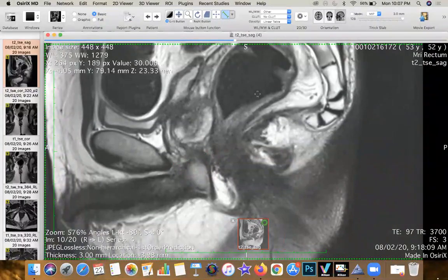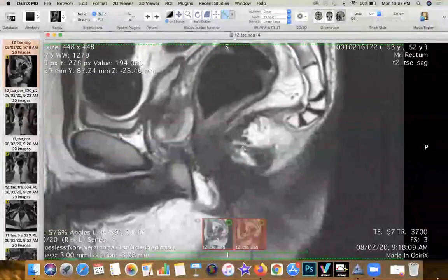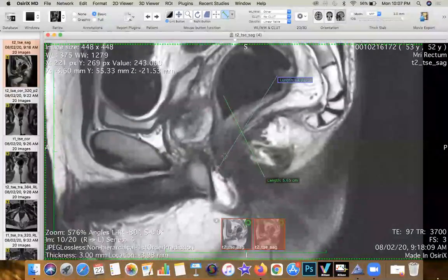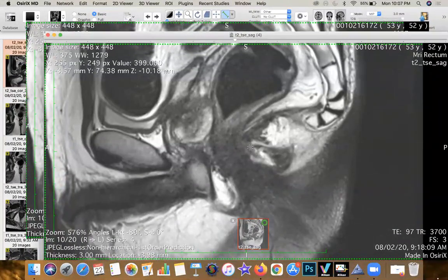So once you've got these two, you have the anorectal angle. The anorectal angle, tomorrow Dr. Sarup will again show you. It's basically very easily drawn. That's the anal canal, and that's the posterior wall of the rectum. This angle, which is subtended between these two lines, is called the anorectal junction angle. Now, what is the normal range? The normal range is anywhere between about 108 to about 127 degrees. Some people say 105 to 122, 123, but by and large at our institution, we use the range between 108 to 127. It tends to work very well.